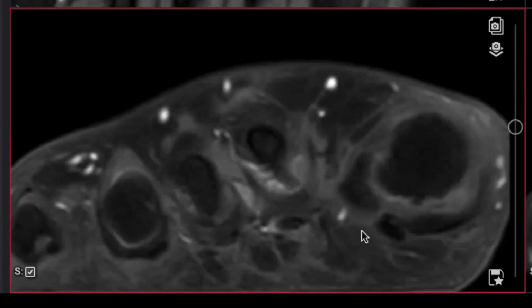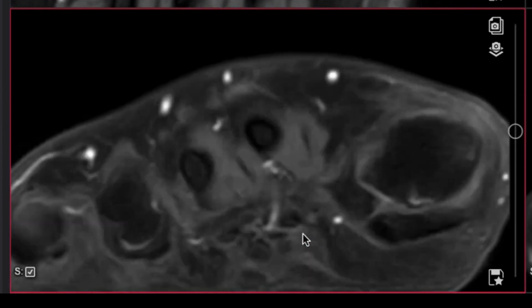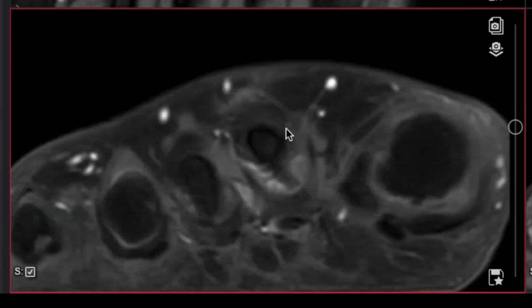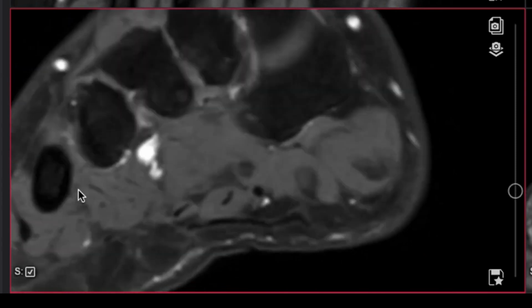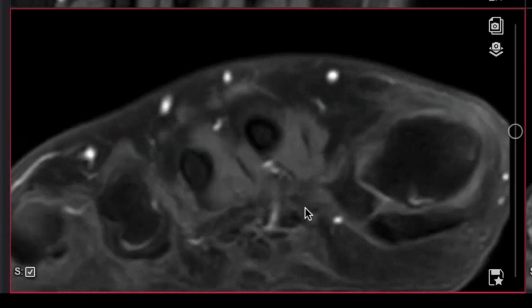Additionally, I'll take a look at the forefoot parabola in general because I'd like to understand if this patient has neuropathic change or what is the degree of pressure. And in this case, this parabola has this appearance of this type of forefoot supination mechanic. And I'd predict that this patient had some kind of pes cavus.